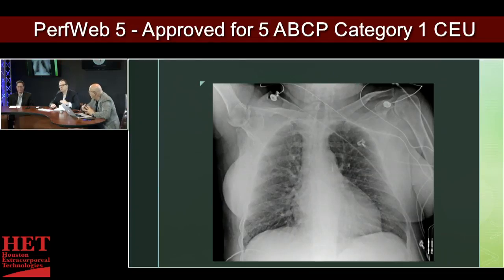So if you can imagine, if they're coming at this angle, the patient is here, it's going to close those rib spaces, and it may look like the balloon pump's actually higher than it is, or the vice versa is true, or even rotated. And so you have to take all those things into account, and that's why when I go through the x-rays, I go in that exact order. Because if the bone structures look weird, or the spinous processes are not lined up, I've got that in my mind when I start to look at the soft tissue, the lungs, and the lines, then that can affect what I see there. And so that's why I go in that order.